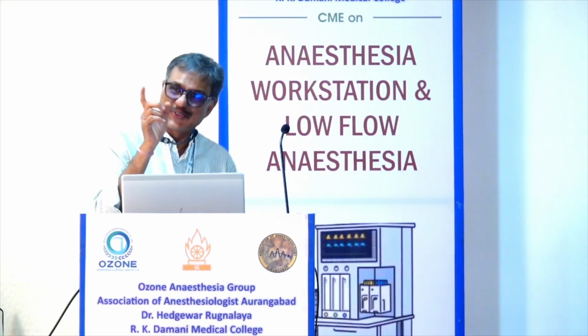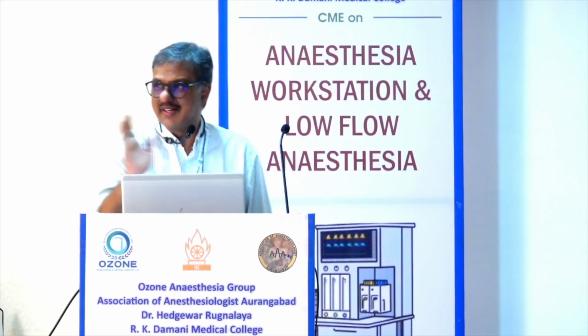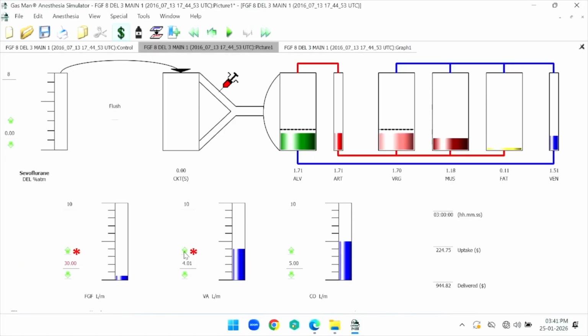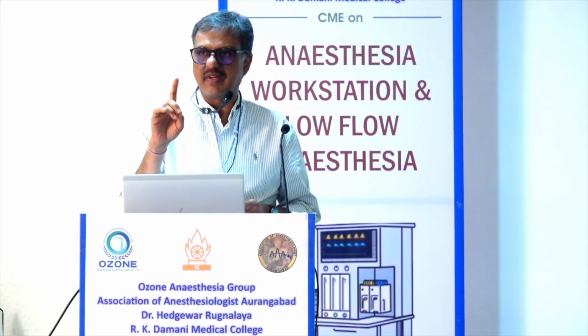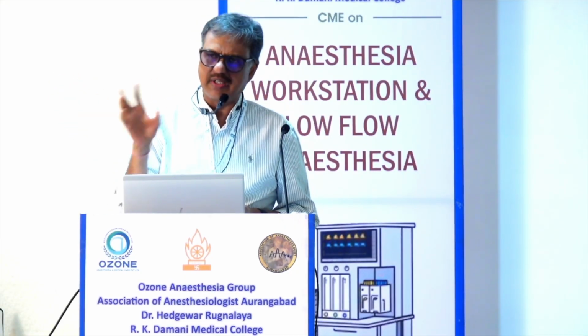So this software also shows that. Now you run it, your recovery will be faster. See, because the gradient will be higher in the circuit. And if I increase the flow along with that, look at this. 6 minutes, patient is out. Fine. So that's about the software. You can download the software with a single mail ID. Use it for 1 month. You'll get the complete idea.